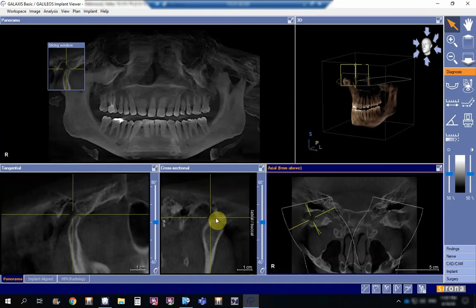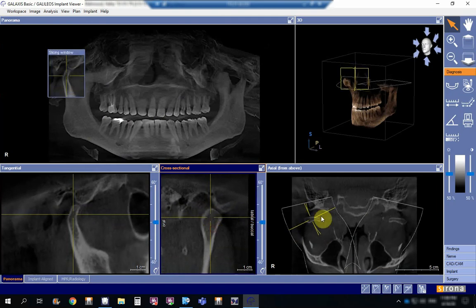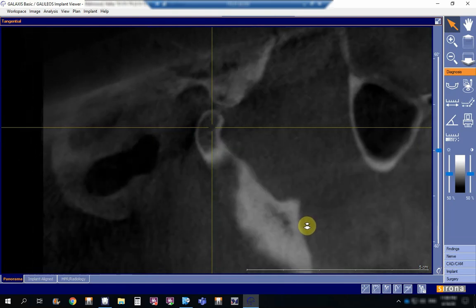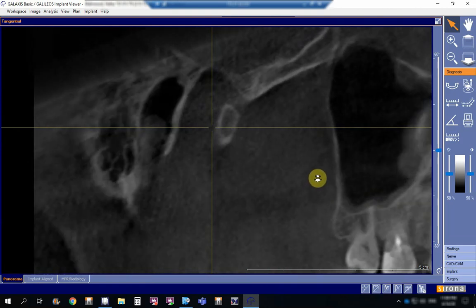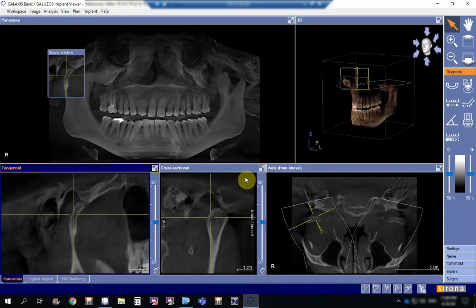See, there is no more coverage of the condyle, so it's out of scope. I can bring it back from here. This is turned blue. I can bring it back in the middle of the condyle. See, I have actually changed the position in the three planes. So the tangential actually moves in a mediolateral direction of the image. Okay, we are in the condyle now.